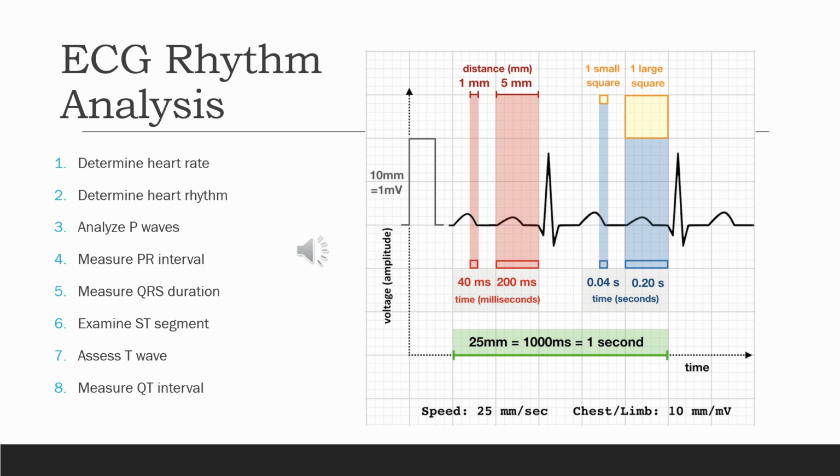If there is an abnormal P wave, then we may have an ectopic atrial focus, meaning that the impulse is not actually originating from the SA node. So remember, if there is a P wave present and it looks normal, then typically that's going to mean that we've got some sort of a sinus rhythm occurring, because it's originating from that sinoatrial node.